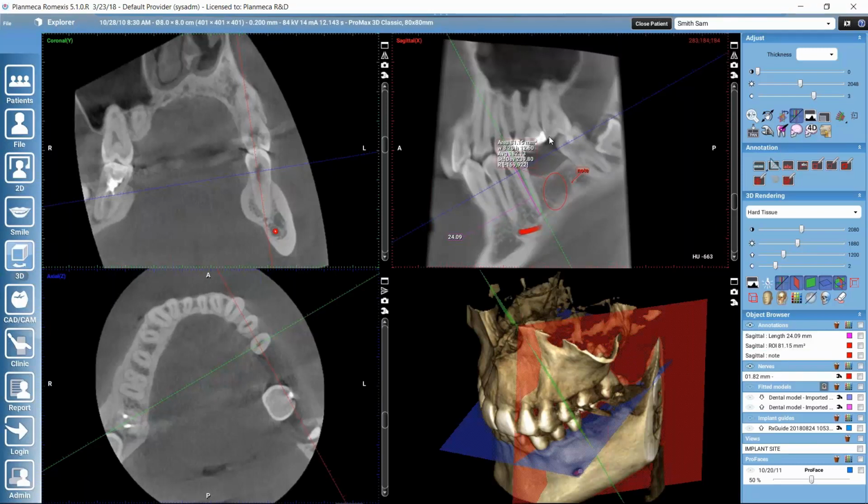this now, in addition to the dimensions of the ellipse, it actually also gives me the average HU value on this area. In addition to these, we can also make three-dimensional objects here, so we could measure cubes and ellipsoids also, but let's cover that in the tutorial that is about segmentations in 3D imaging module. And then something about these annotations here.